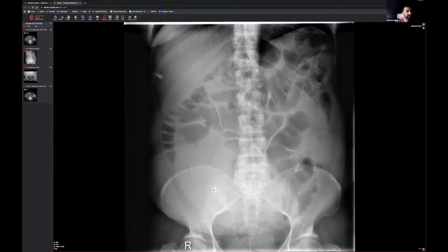Maybe you've jumped onto CT, which is fine, which is great. If you haven't, you've got some good differentials there, so yeah, that's good. Iliac bone infarct, yeah, I guess it could be. If you had just had that sitting by itself and nothing else going on, then you may say to yourself, this could be an iliac bone infarct. Oh, one more thing it could be is a renal calculus.